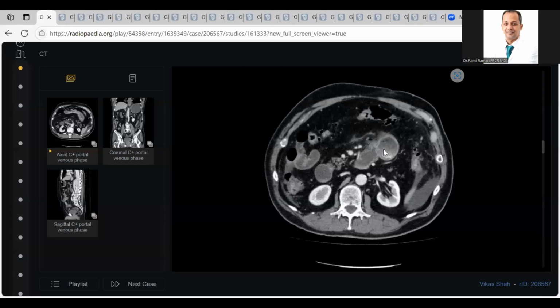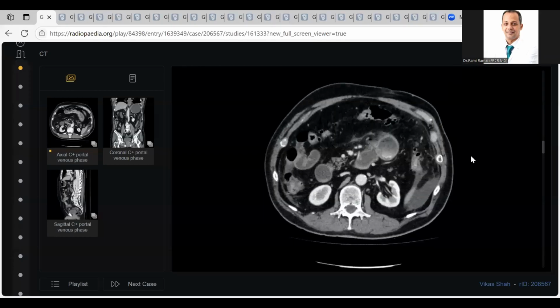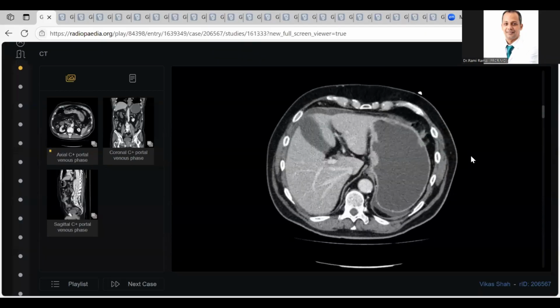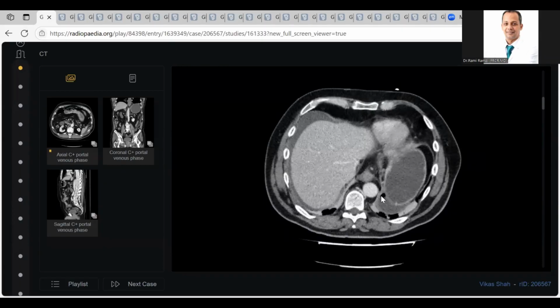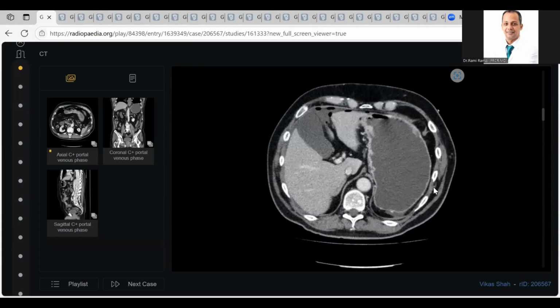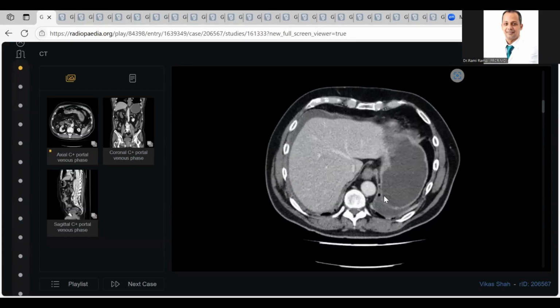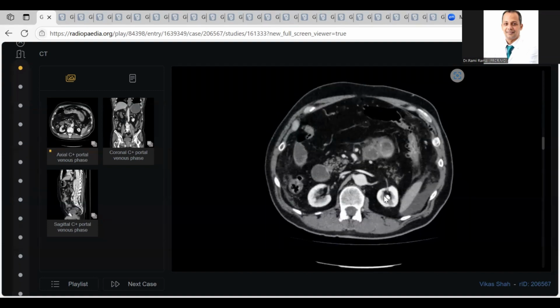The patient has no fever. The patient only has acute, severe, sudden abdominal pain. Again, see, okay, one second. What is this? Effusion and pneumoperitoneum is also there. Yes, sir. Pneumoperitoneum. Okay, excellent.